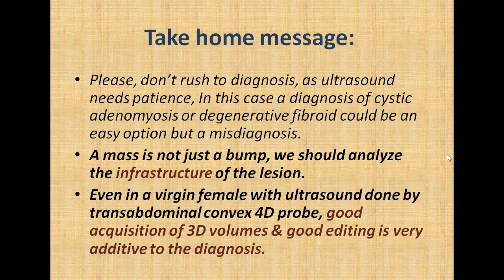So the take-home message: please don't rush to diagnosis, as ultrasound needs patience. In this case, a diagnosis of cystic adenomyosis or degenerative fibroid could be an easy option, but a misdiagnosis. A mass is not just a bump. We should analyze the infrastructure of the lesion.